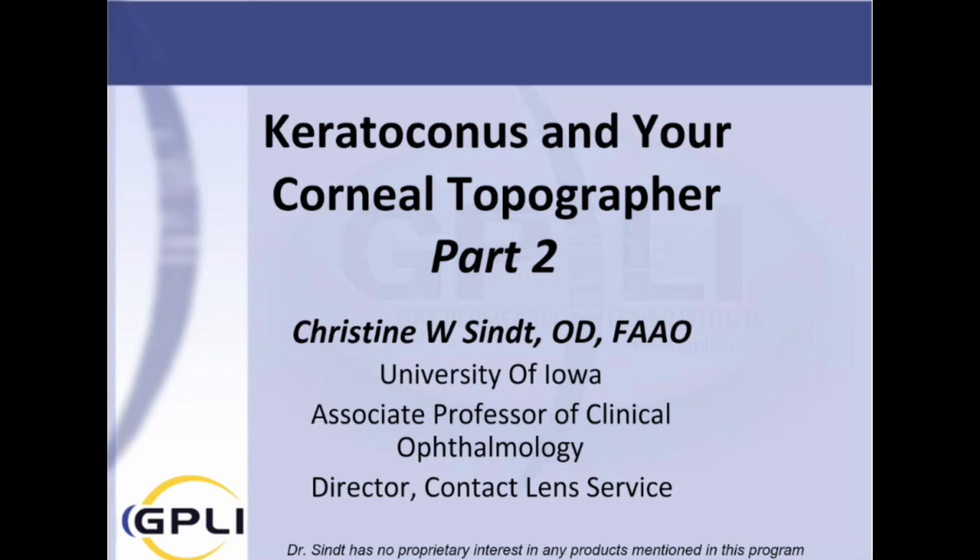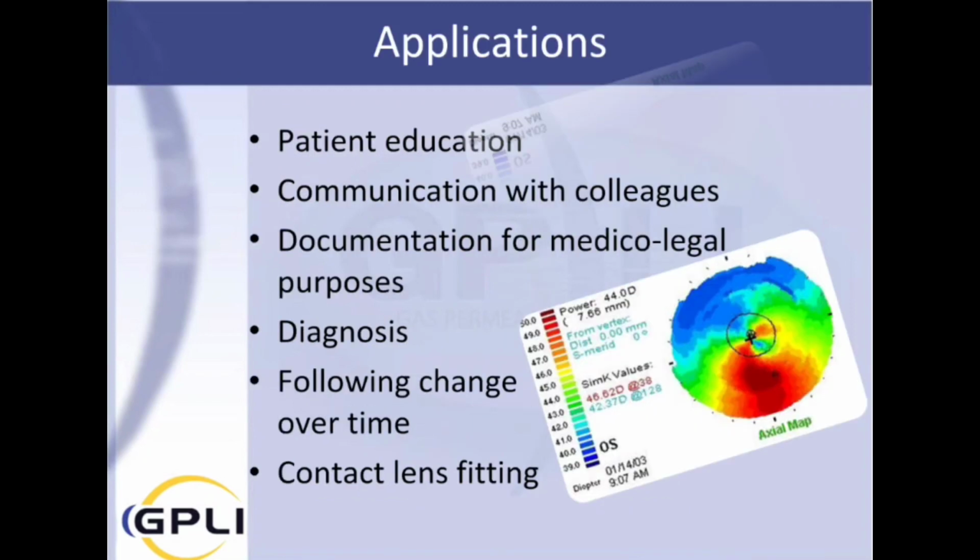In this module, we are going to discuss utilizing your corneal topographer for diagnosis and management of keratoconus. Clinical applications for corneal topography include patient education, communication with colleagues, documentation for medical legal purposes, diagnosis, following change over time, and contact lens fitting.